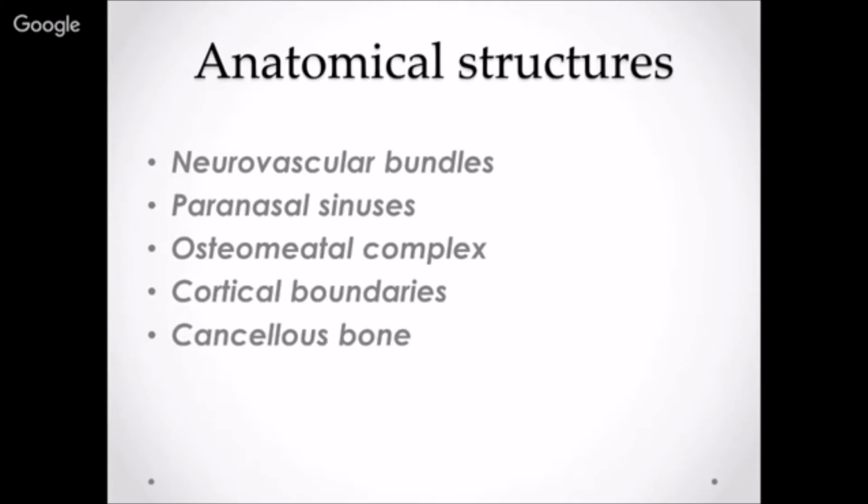You want to keep an idea, even when it comes to accessory foramens, this is one of the primary concerns. What is an accessory foramen for? It usually has an accessory blood vessel or a nerve ending that is passing through it. So that is the critical nature of looking at any kind of neurovascular bundles, or the need for looking at those bundles.